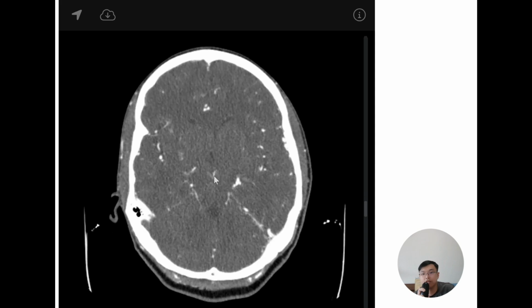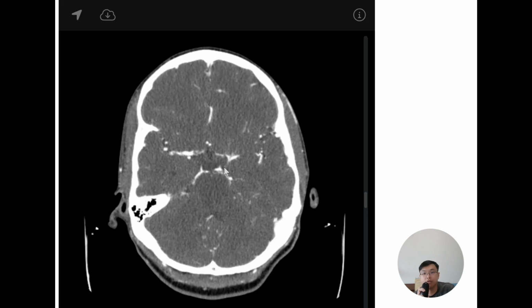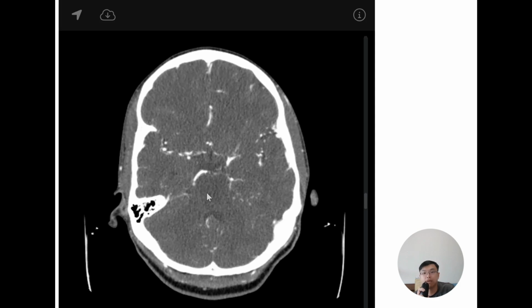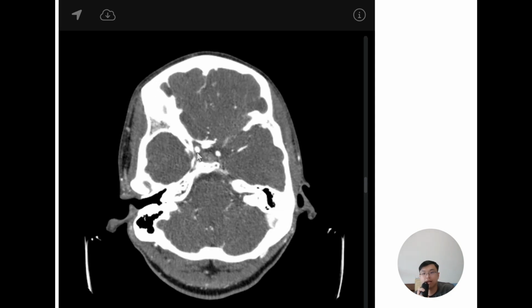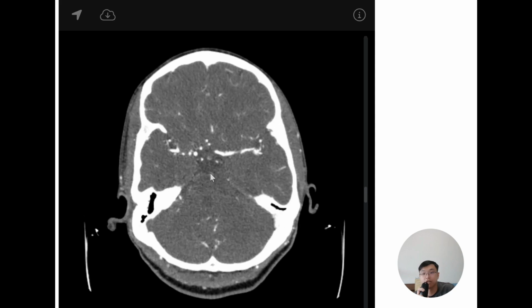And later on, you'll ask the question, why is the basilar artery occluded, but there is still arterial flow to the terminal branches like the PCA, posterior cerebral artery? The main reason is they are getting the blood from the posterior communicating artery, which is drawing the blood from the ICA here and then through the posterior communicating artery reaching the terminal branches here.